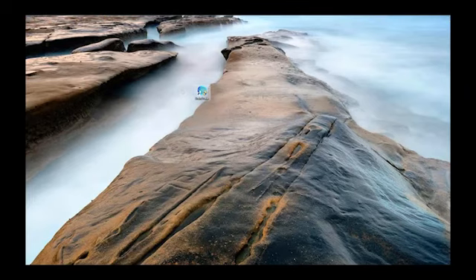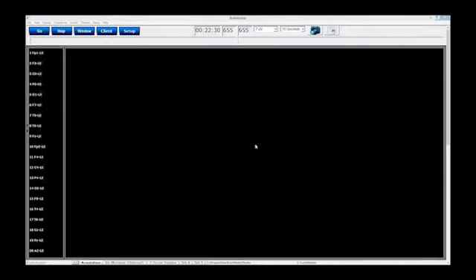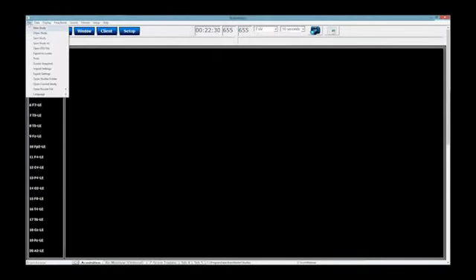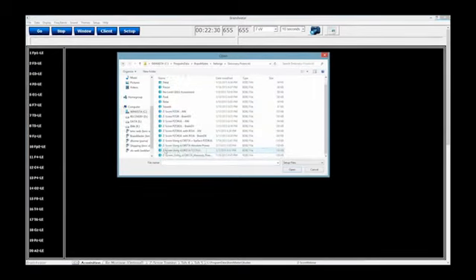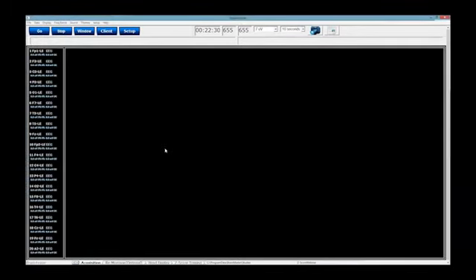All right. So now that we've gone in depth about the absolute power version of it, let's now go through the sLORETA PZOK UL version, because there are some differences between Surface and sLORETA. Not as many as you would think, but there are. So I'm going to go right here. Okay, so far off the bat, after I loaded it, you're not going to notice that much of a difference.